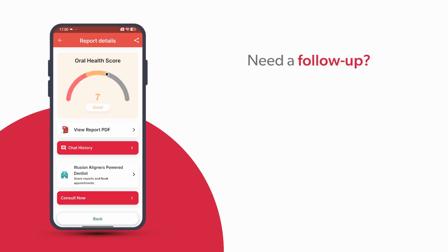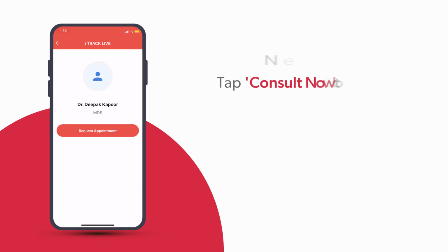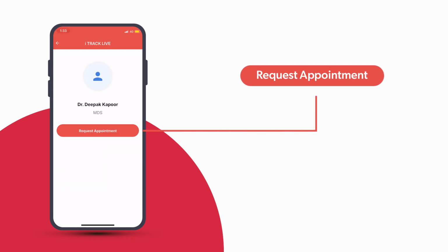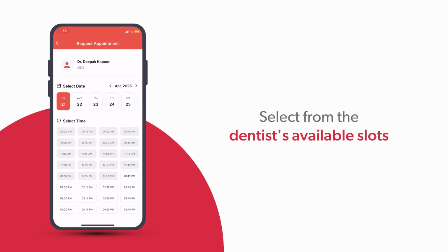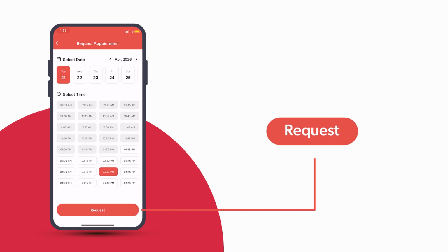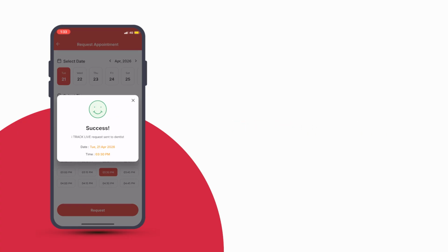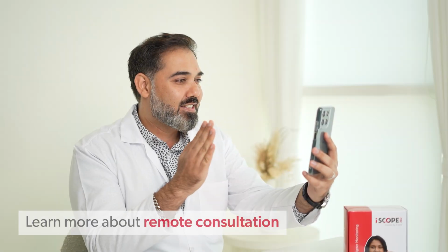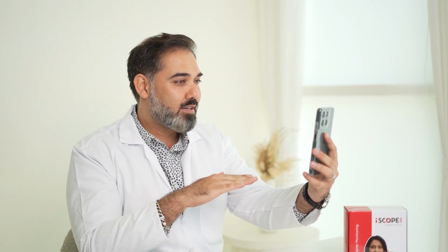If a follow-up is needed, the patient taps Consult Now to start the appointment process. By tapping Request Appointment, the patient selects a preferred date and time from the iTrack Live calendar. The request for an iTrack Live session is sent to the dentist for confirmation. To learn more about remote consultations, watch the next chapter in our series.